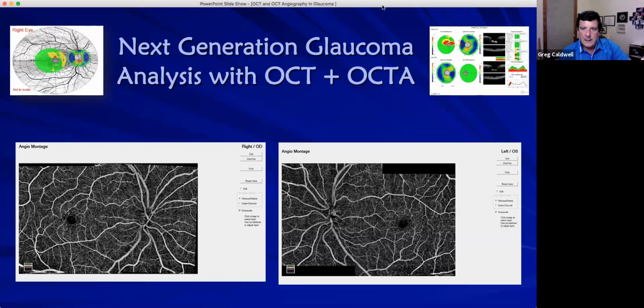I'm using GCC, as you can see in this case here. I'm using retinal nerve fiber layer. I'm using GCC in the glaucoma case, but you're going to see I use the radial peripapillary capillaries and what's happening in that macular density when I follow these glaucoma patients. And it's been a nice little another tool. We have the visual field that provides that function measurement. GCC and nerve fiber layer is a structure measurement, and measuring the capillary density and the radial peripapillary capillary density is another structural measurement. And it's been nice in following some of these patients that I have.